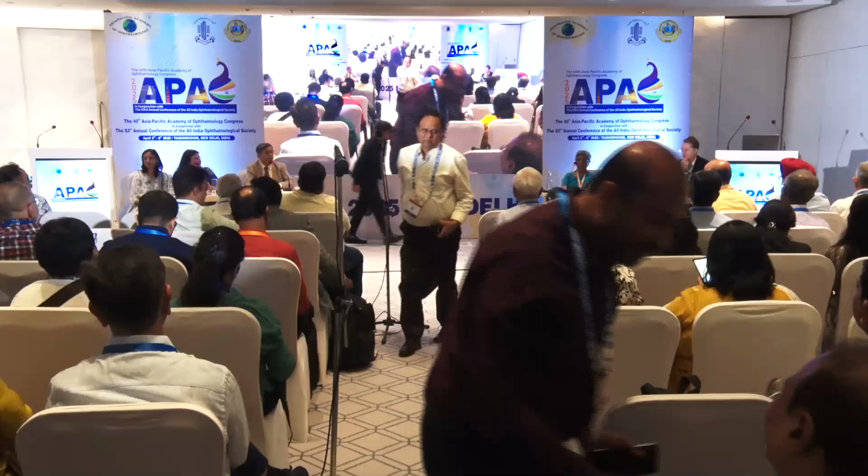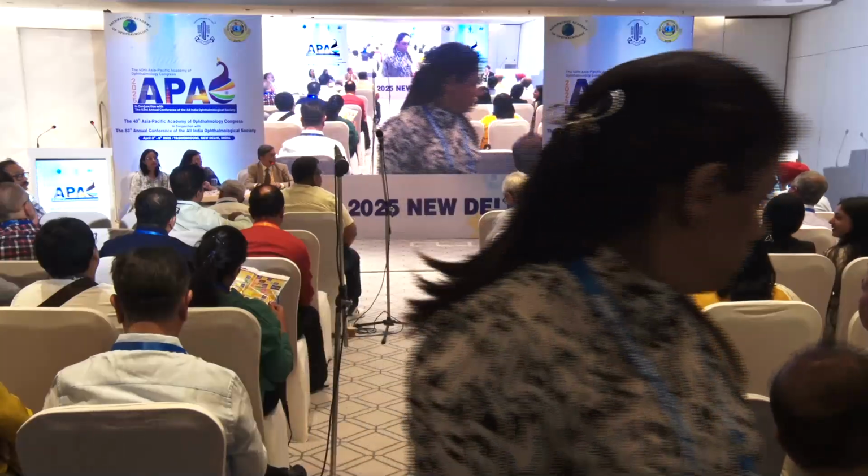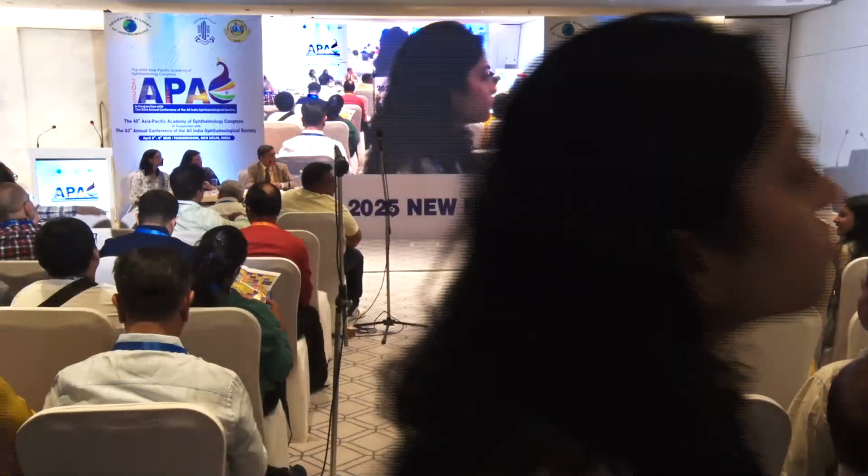I think it is correct still that OCTA cannot really go through the serous-sanguineous PEDs. So sometimes if it is serous, you could still get something. But I think it's difficult. The only thing is that sometimes at the edges you could appreciate something. Or if you sit at the machine and try to segment, then you may get something. But very large PEDs, still I don't think you can get good images. Yes, same thing with the posterior staphyloma also. If you have a very high myopia, then in a setting of posterior staphyloma, it becomes really difficult. But low myopes, it's very good to pick up myopic CNVM.